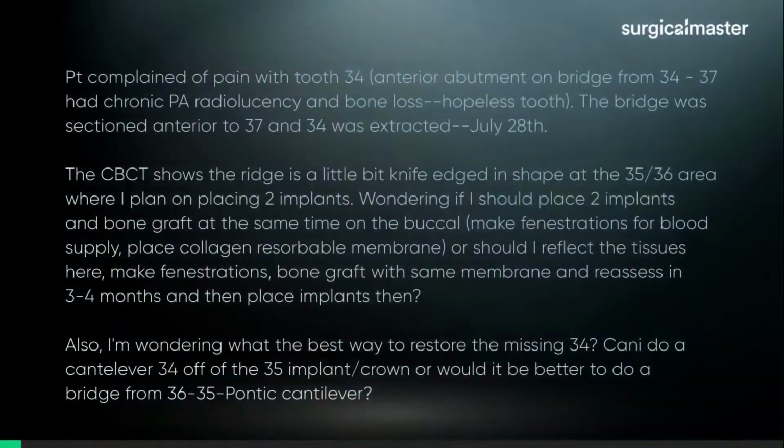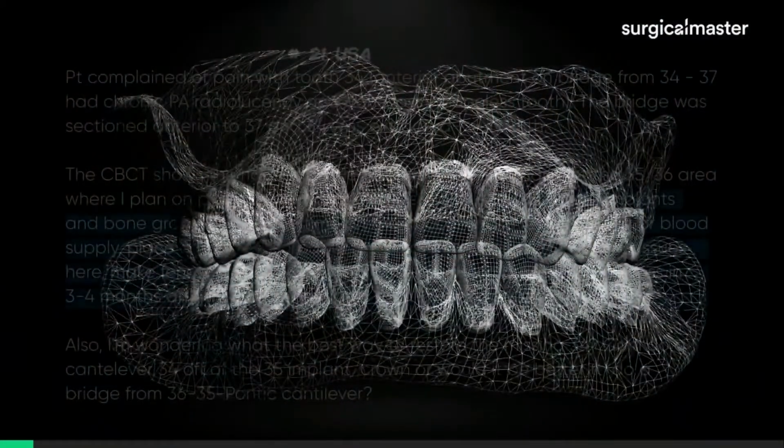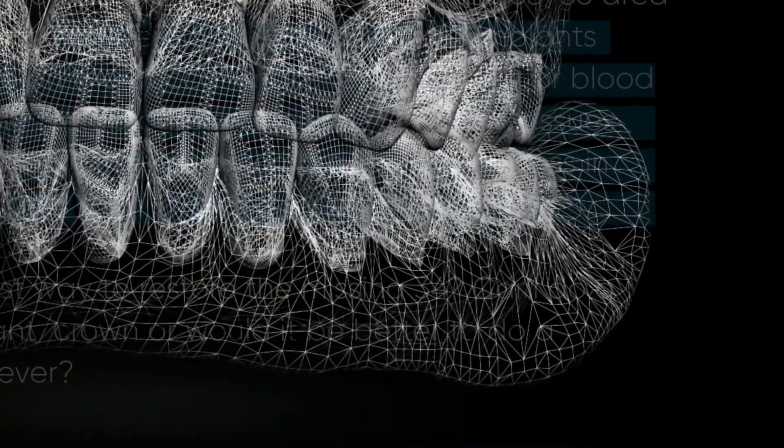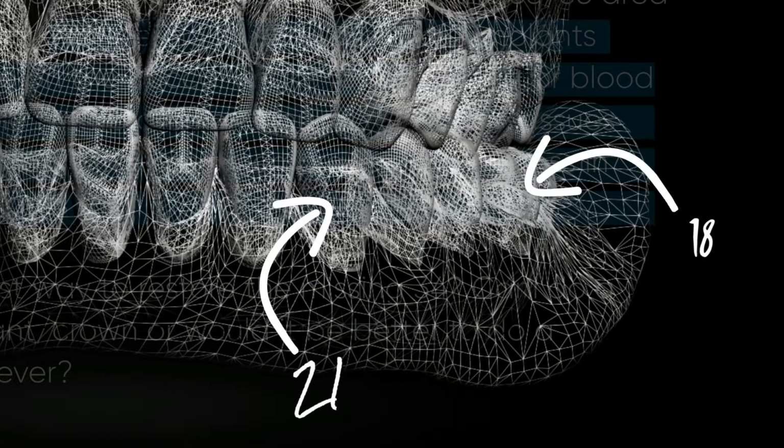Just generic. Yeah. Generic, 4-unit bridge. Well, that's kind of a short span, but that's okay. Because you need like a molar and a premolar. Oh, sorry. That's okay. Let's make them a little, like... That's fine. That's fine. Beautiful. Well, there was some mesial drifting.